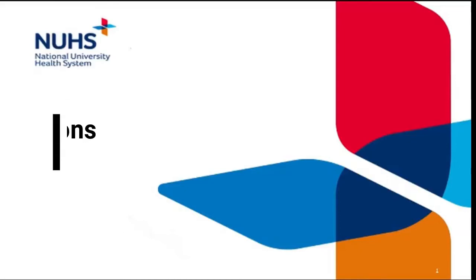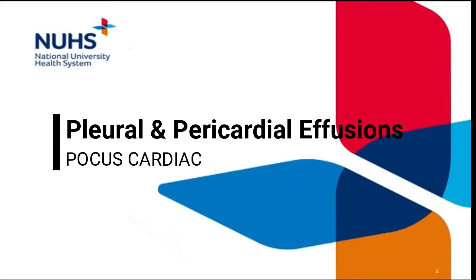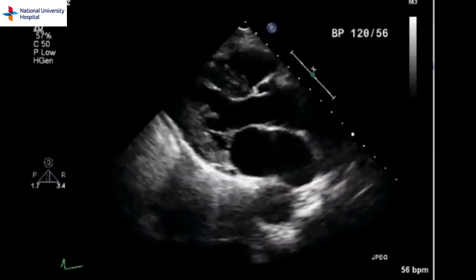Hello. Today's tutorial will cover pleural and pericardial effusions in the PLAX view. Let's go through how to determine which is what.